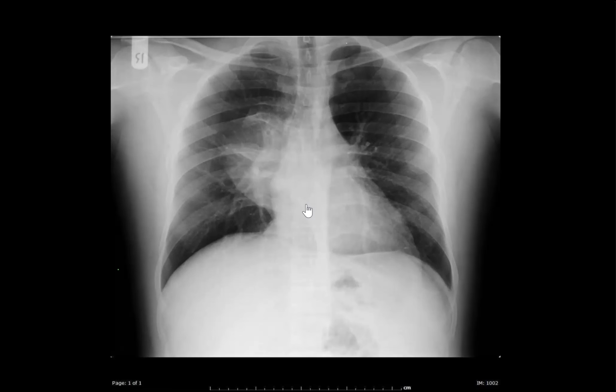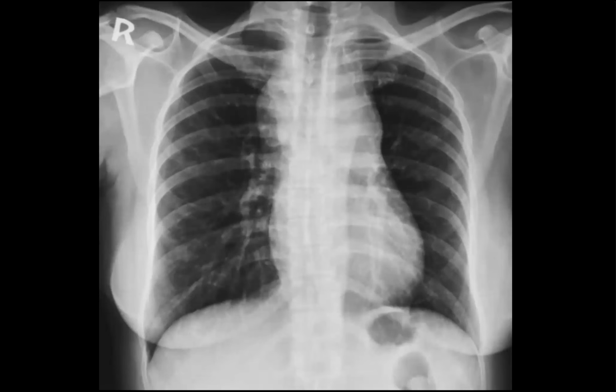Anatomy. Azygoesophageal line. If the mass is continuous with this line, most likely it's of esophageal origin, like a duplication cyst, esophageal leiomyoma, or even esophageal carcinoma. Other differential diagnoses of a posterior mediastinal mass may be extramedullary hematopoiesis if there is widening of the ribs and abnormal trabeculation. Also, maybe a hematoma or abscess if the given history supports that, or if there is destruction of the vertebrae. Very good.